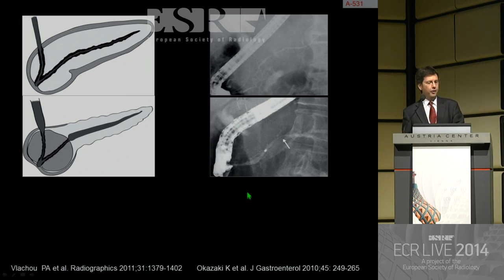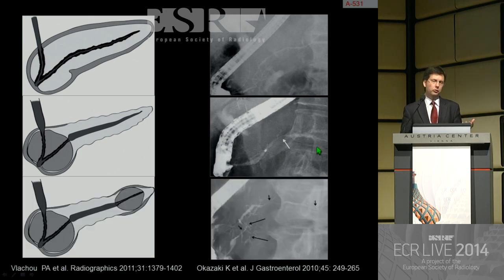going to have involvement of the head, neck region of the pancreas, but relative lack of dilatation more upstream. And here we have a stricture over about 3 centimeters involving the head, neck region of the pancreas, but look, there's not much more proximal dilatation here. If we've got multifocal AIP, we'll then get multiple changes throughout the pancreatic duct. And you can see here we've got various segments of narrowing with slightly irregular side branch narrowing arising from these abnormal segments.